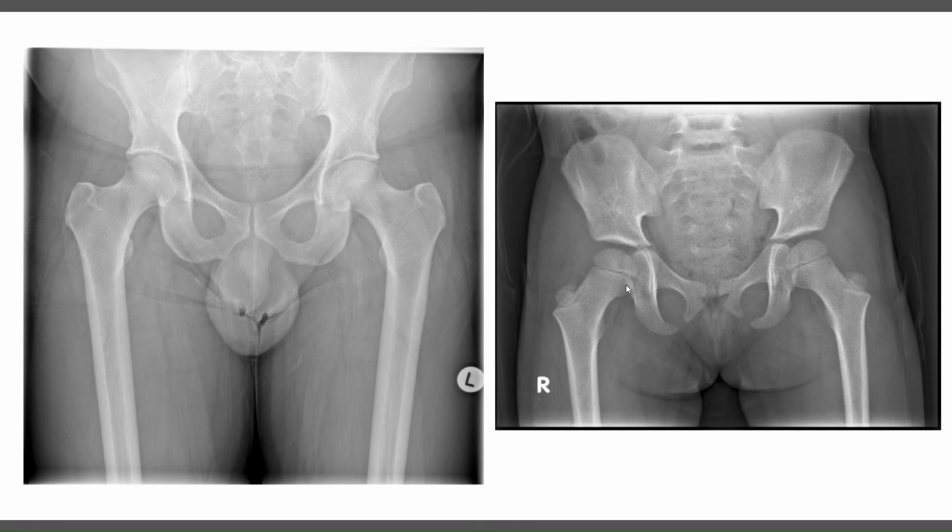Now look at this one on the right. If you look at the femur, there's a space here. There's a space here. There's a space here and here. Is that a fracture? Well, no, those are the growth plates, or physis. So this is the physis. There's another physis here. If you look on this adult, the physes have closed completely here. And even here in the pubic rami, there's an open physis. So if you're looking at this side, we'd say this is an AP of a skeletally mature patient, and on and on. On this, we'd say this is an AP of a skeletally immature patient.